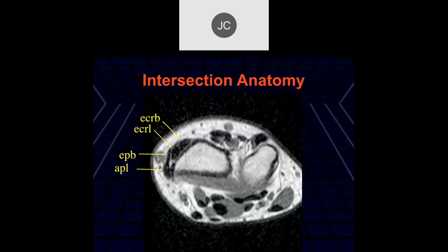Now they start out with the first extensor compartment radially located with respect to the second extensor compartment, but the muscles of the extensor pollicis brevis and abductor pollicis longus are more medially located, so they have to cross over one another in the distal forearm.